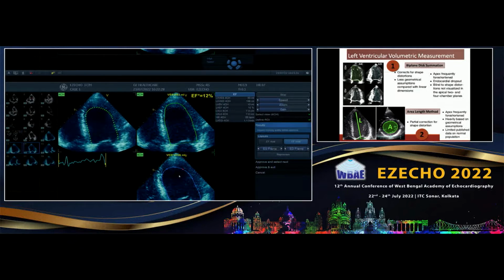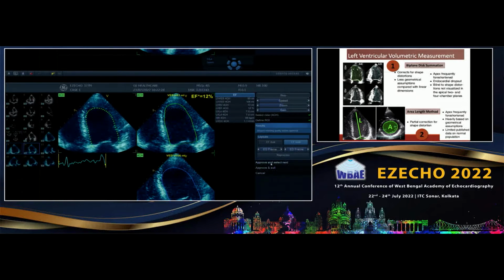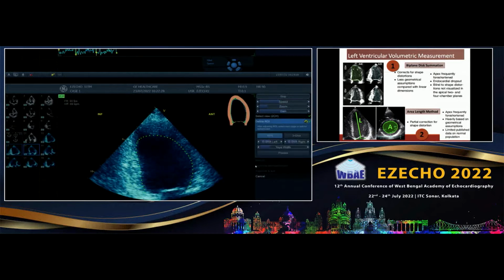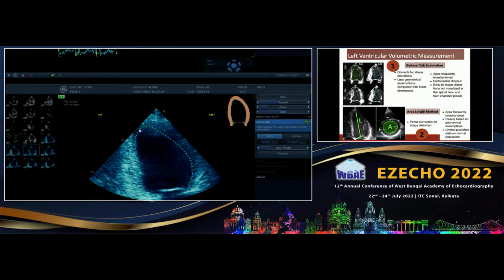Now perfect. So now let me ask you, Nitin, just to start a discussion. Would you like to do the automated version or the 3-click, which is also available, or a manual tracing? What is your experience? Actually, with the 3 clicks, generally you have to do a little less adjustment rather than the automated. But I think the machine learning is improving and probably in future won't need it. Otherwise, it does a very good job when there are good quality images. But some touch up you have to definitely do, okay? So we are not completely excluded by the machine learning.